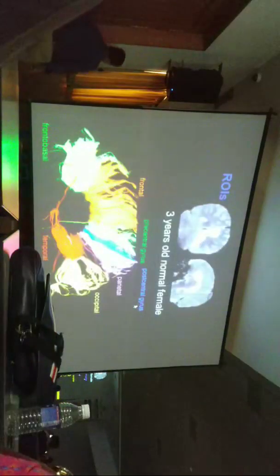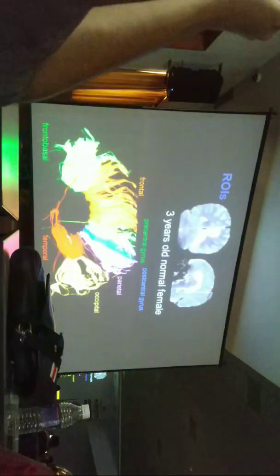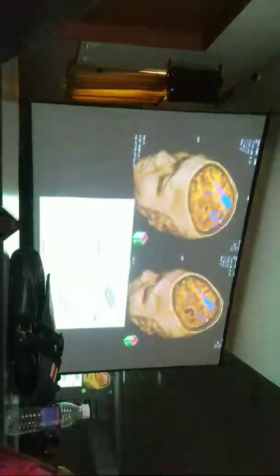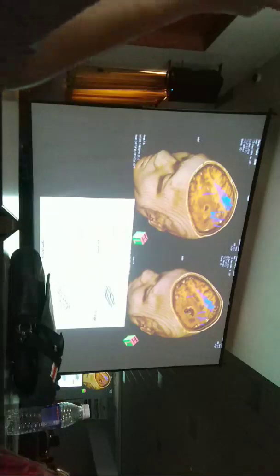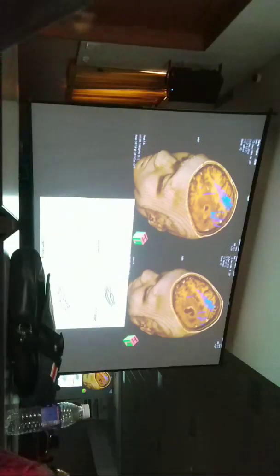This is tractography. If you put a region of interest on the corpus callosum, then you get the entire fibers traversing along this course; the computer calculates and gives this tract. How do we interpret this DTI? There are four ways that you can interpret. First, whether a tumor or any lesion is causing deviation of the white matter tract. Second, whether it is infiltrated, destroyed, or just swollen.